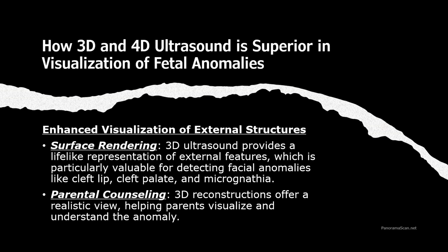The 3D reconstructions help in parental counseling by providing parents a realistic view of the anomaly. This can ease their emotional response as they are better able to understand the condition, making it easier to discuss potential treatment options and outcome. With these advancements, 3D and 4D ultrasound plays a crucial role in early detection and communication of fetal anomalies, ensuring a comprehensive and compassionate approach to care.